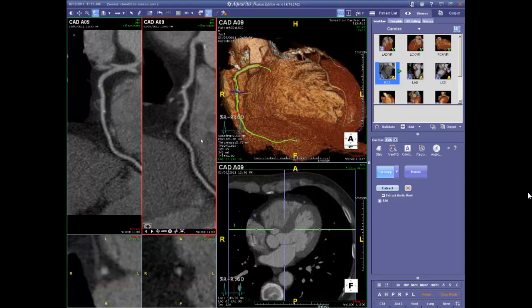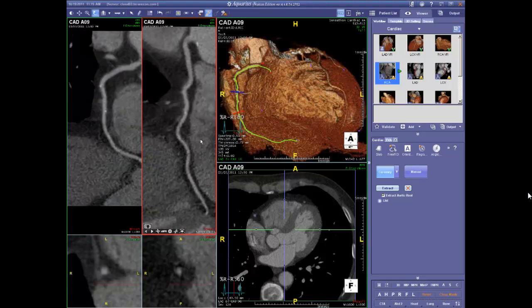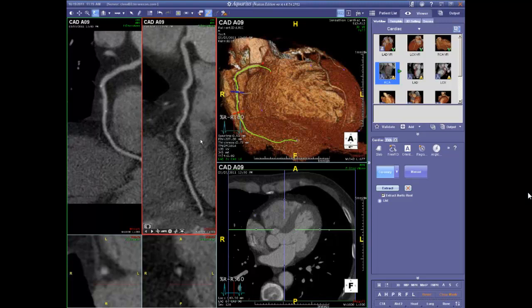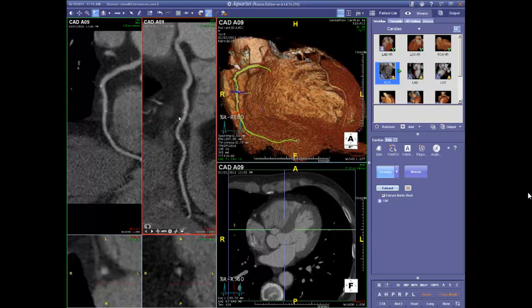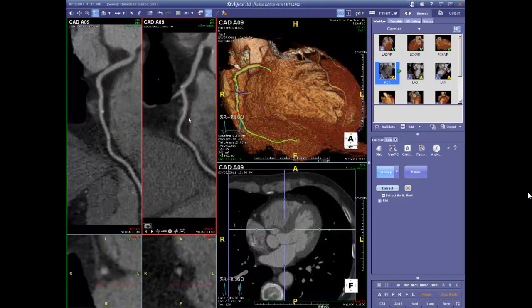In other words, the raw data has now been taken, and we have something akin to a map of the globe which has been pressed into 2 dimensions. So we have something which is not anatomically faithful to adjacent structures, but is really the entire course of the right coronary artery laid out here for us to view. And by sweeping the mouse back and forth, I can pick up an area of calcium here and an area of calcium here. And I think attendees watching, if you've seen any CTAs, would recognize that this is simply mural calcification.